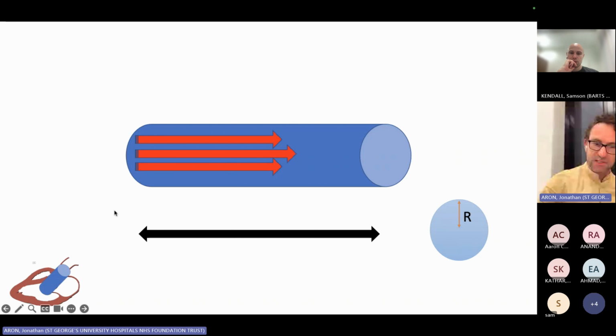And this distance we can very nicely measure with the VTI, or the velocity time integral, which is the distance that a blood cell moves through the left ventricular outflow tract during 1 beat. This distance times the area of this tube gives you the stroke volume, and the stroke volume times the heart rate gives you the cardiac output.